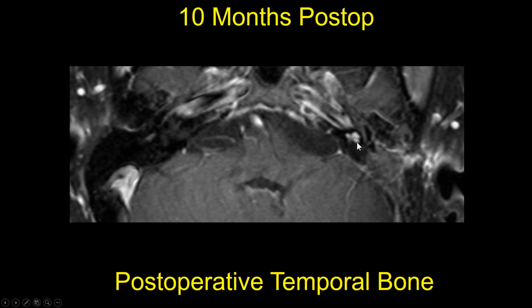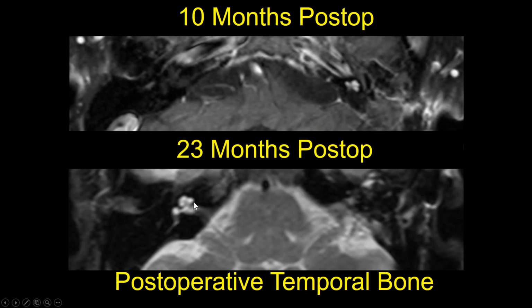And this patient postoperatively had abnormal enhancement within the cochlea. This is not residual or recurrent tumor. This is simply labyrinthitis ossificans that we might see postoperatively. And when we compare the T2 imaging, here we nicely see the CSF-like normal bright T2 signal on the right side, but on the left side we see lack of that bright signal, and we see abnormal enhancement in the same place. So on MRI, we lose the bright CSF-like signal and we might see enhancement, and on CT, we might see increased deposition within those structures themselves.